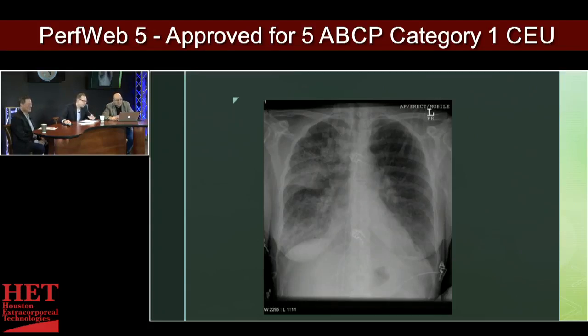No, I think you're starting to accurately describe the picture that's going on. Obviously, there's a difference between the left lung field and the right lung field. You can see it's a lot more radiolucent here, darker, meaning it's aerated, normal-looking tissue. And then over here, it's much denser, and it means that there's a process going on.